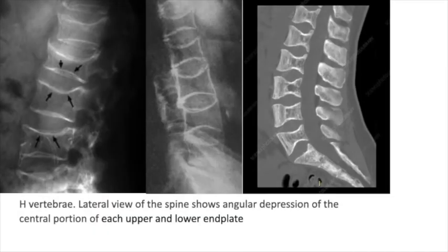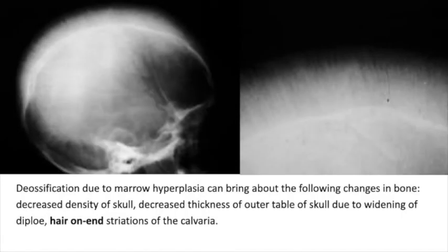So I can show you here a few examples of biconcave vertebra. You can see the arrows there. Also, you have to look at the explanation of why it has this shape. Remember, the central part of the vertebra is too soft, so there is compression of the end plate by the intervertebral disc, and then the vertebral body takes this shape. It's very important to know that.